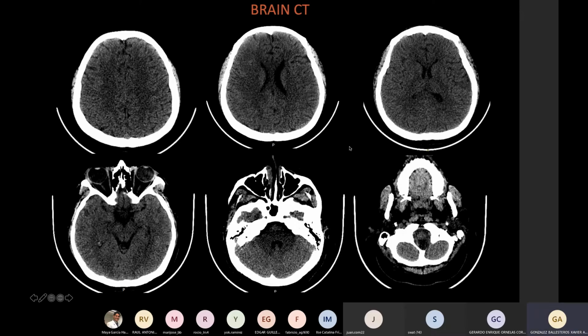So in a patient with suspected stroke and a normal brain CT scan, as in this patient, that rules out hemorrhage, we should perform an MRI. And also, it is important to remember that CT has a minor role because of its lower sensitivity to detect white matter lesions.